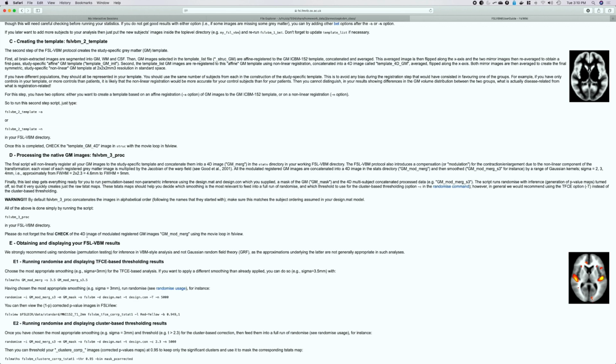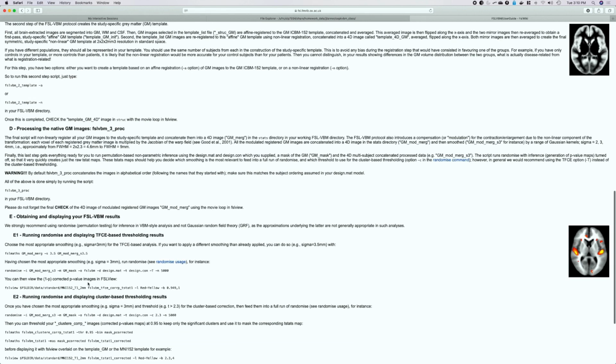And you can check the image. So you'll always want to look at the image. And we won't do this for our purposes. I won't demonstrate it, but you can follow this guide.